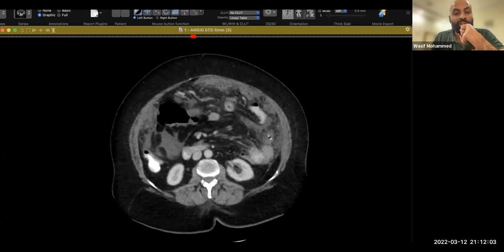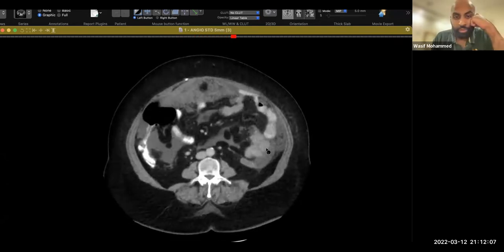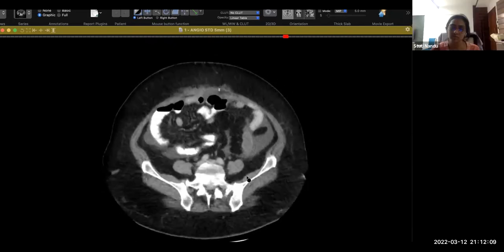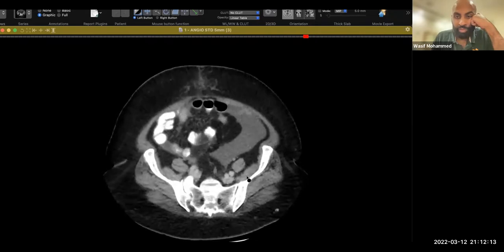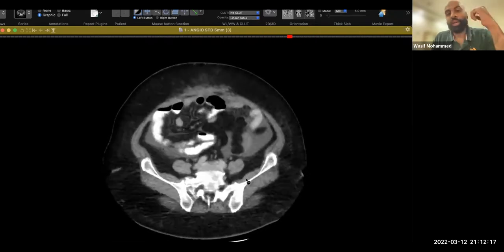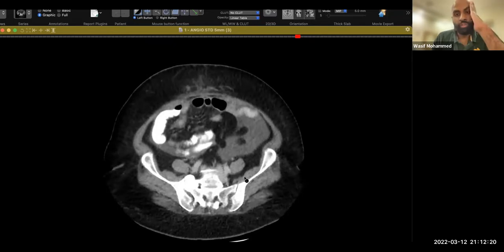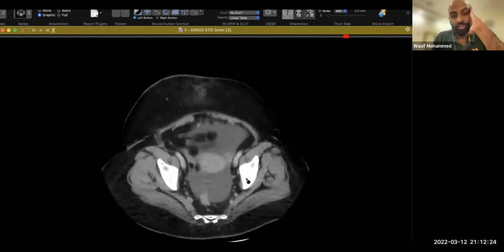Over here, you can see that there is massive omental caking, which we eventually got to. There's also fluid, and these are the striking findings, right? So you need to go hunt for the associated features or the pertinent negatives. In your mind, you're already thinking TB, you're thinking metastasis, you're thinking other things which can cause this, like mesothelioma, right?